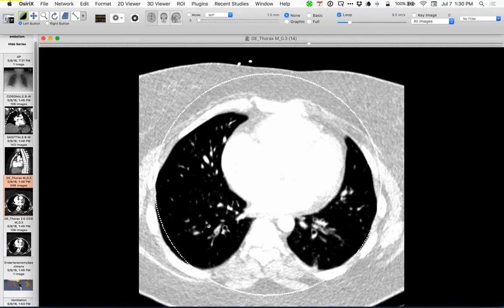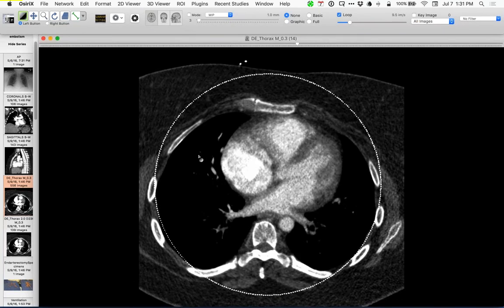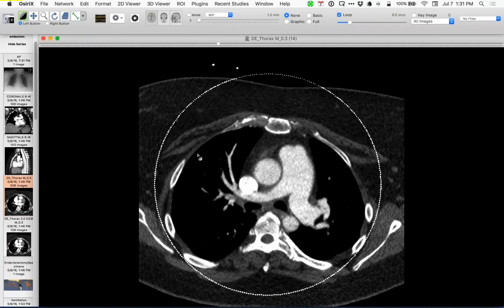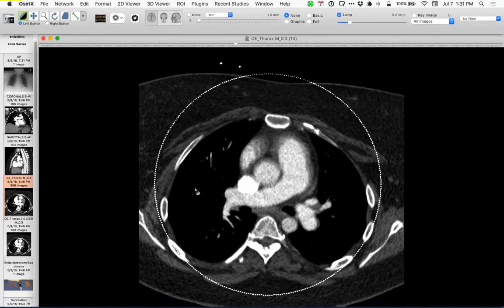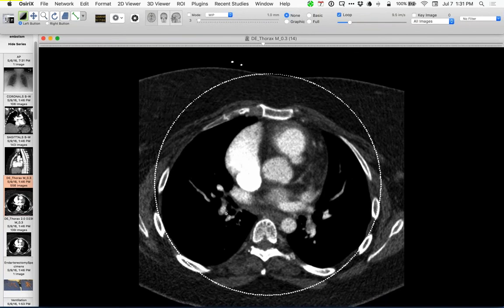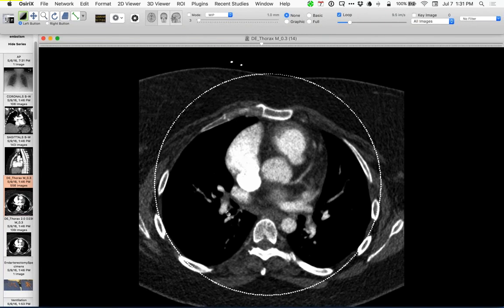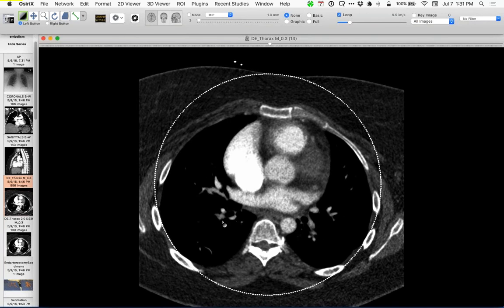Now let me switch over to the vessels. Of course, we'll have a dilated right atrium and right ventricle. But in looking for central clot in the big vessels, left and right, so far we don't see it. But just look how dramatically these vessels narrow up. There's a huge difference between the caliber of these arteries and these here. These are really reduced remarkably in caliber. There's a bit of motion and sharpness there, but these vessels are very abnormal, very narrowed, and irregularly narrowed.